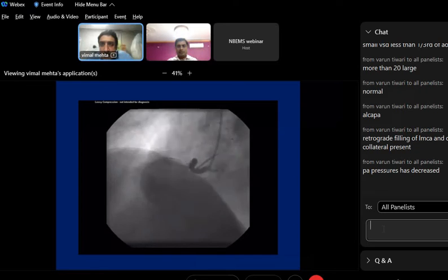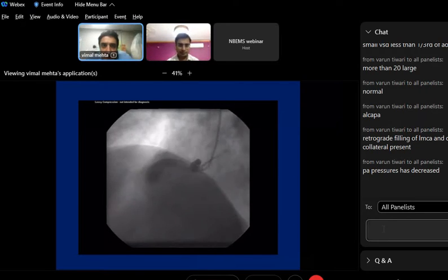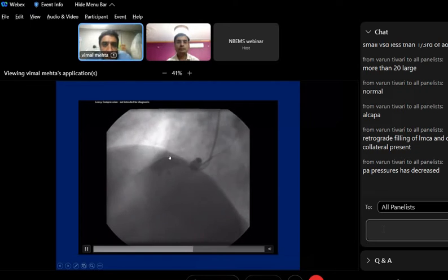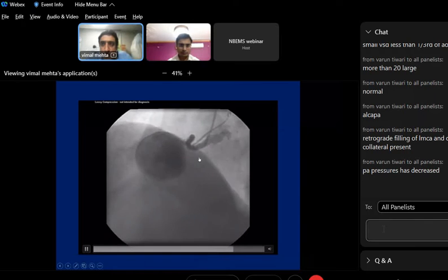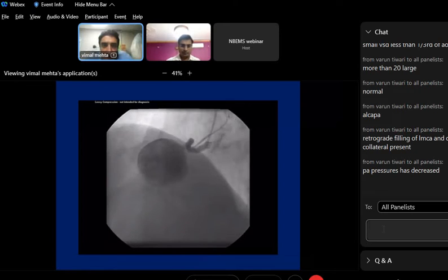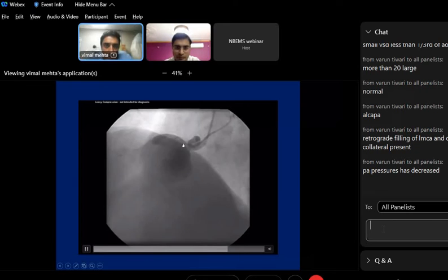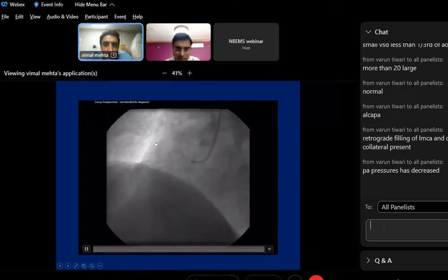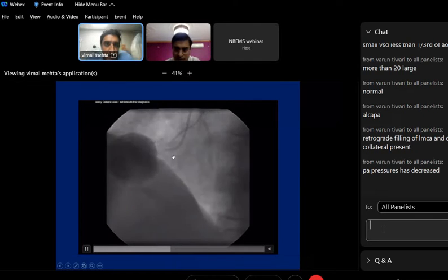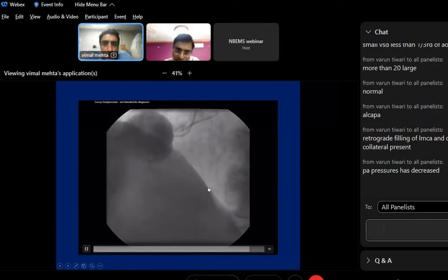Yes. So this is classical. This is a coronary artery aneurysm, and as you cannot see any ventricle getting filled, whatever it is, it needs urgent management. The patient needs a graft to the distal right coronary artery by isolating this aneurysm, by suturing it, and if possible removing it. So right coronary aneurysm is the correct answer.